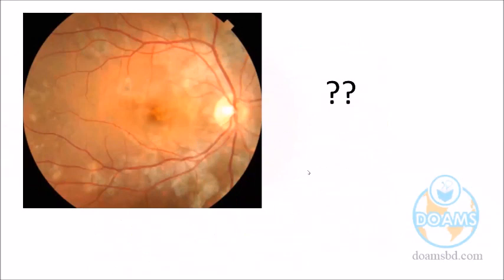Now look at the picture, what you are looking at. If anybody willingly can say. Angioid streak. You are thinking that there are angioid streaks, but these are not vessels, only like vessels. Yes, angioid. Okay. Any other observation? Is the optic disc okay? At first look, yes, the optic disc is okay. Vessels are coming from the center. There is a normal optic cup and a yellowish color of the optic disc, so we cannot comment that this is a white optic disc or a reddish optic disc.